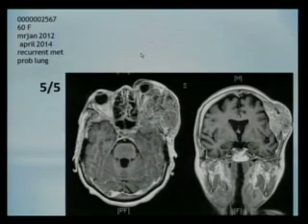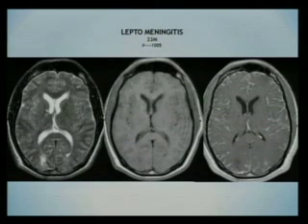And this patient, I think, had lung cancer. Okay, under the category of infection, we'll discuss meningitis and abscess. The classic appearance, which you don't always get, but it's nice if you do, would be like this here. A leptomeningeal enhancement.